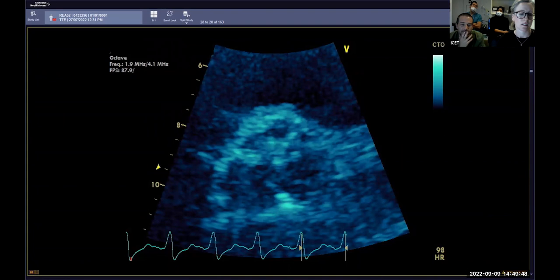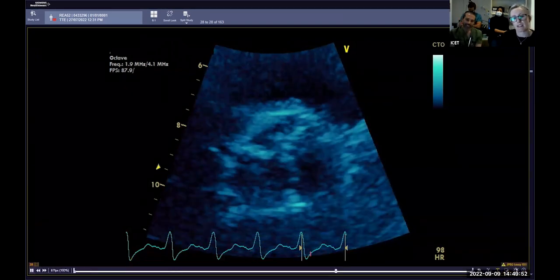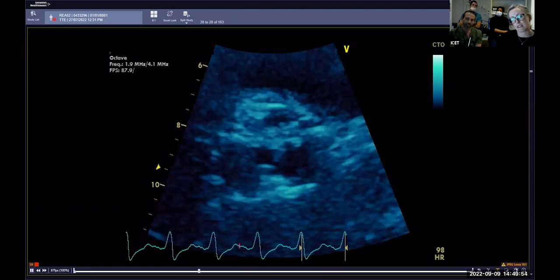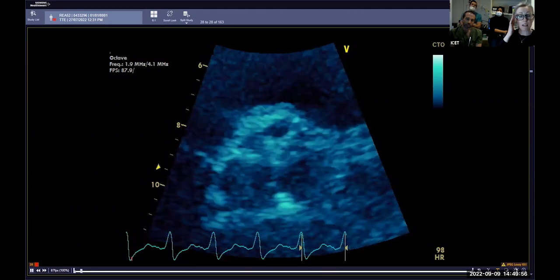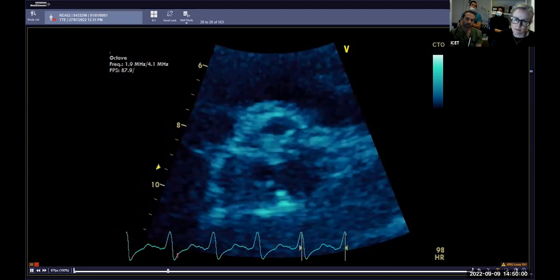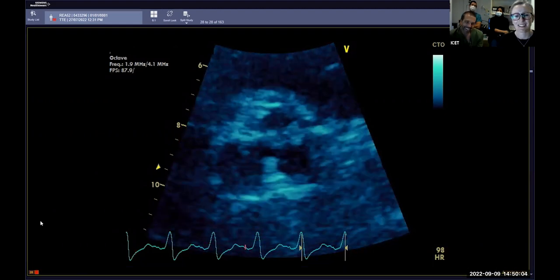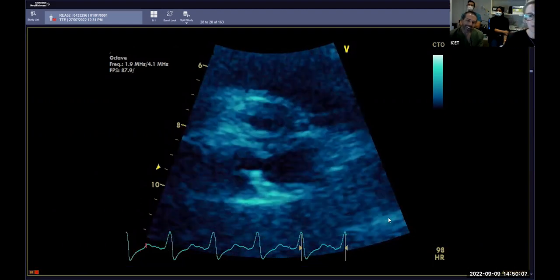So even on this still, it looks heavily calcified.